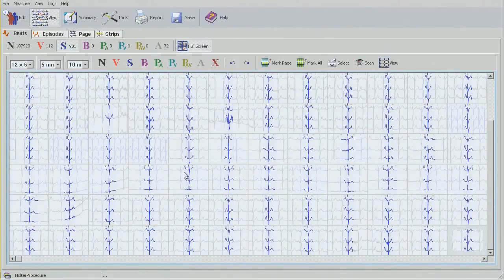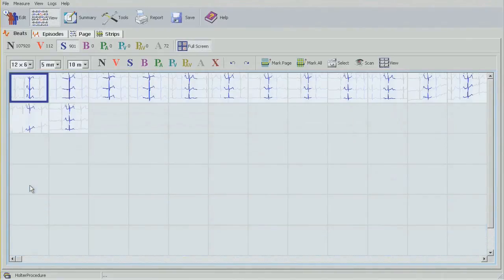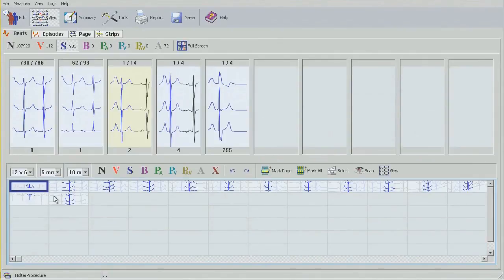So I'm happy with this bin. Moving on to the next one. There are only 14 characters here. I don't even have to go to the screen. I can look them up from this position here.